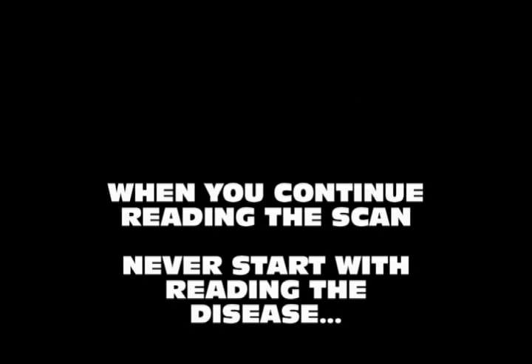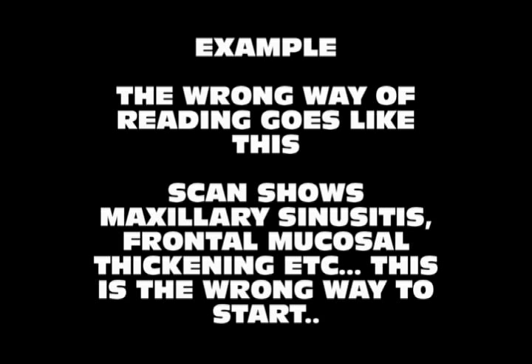When you continue reading the scan, never start with reading the disease. This is the commonest mistake we have seen among residents and PGs. The wrong way to start is: this scan shows maxillary sinusitis, frontal mucosal thickening, etc. This is exactly the wrong way to start. So what's the right way to start?